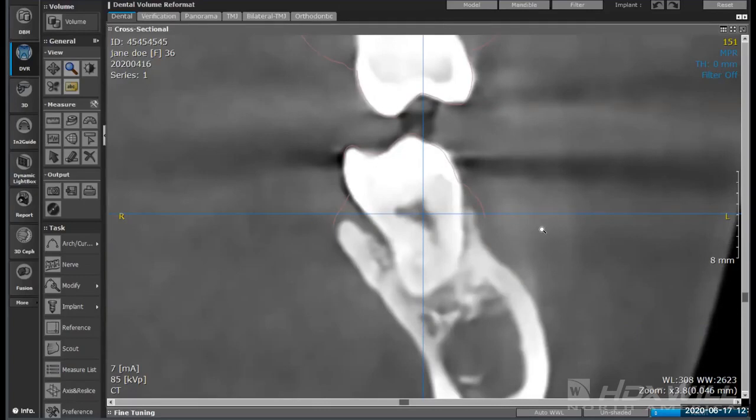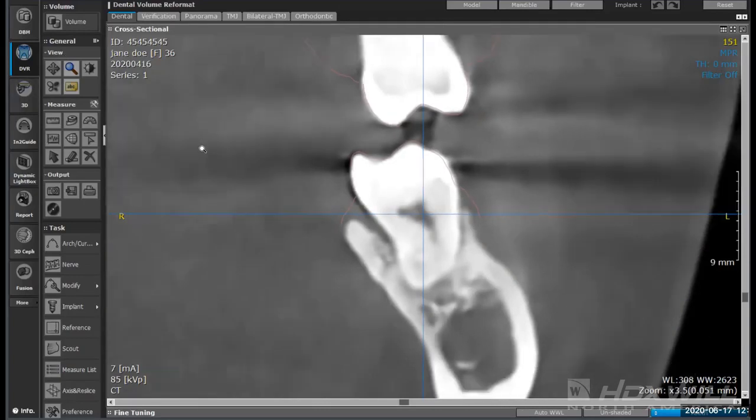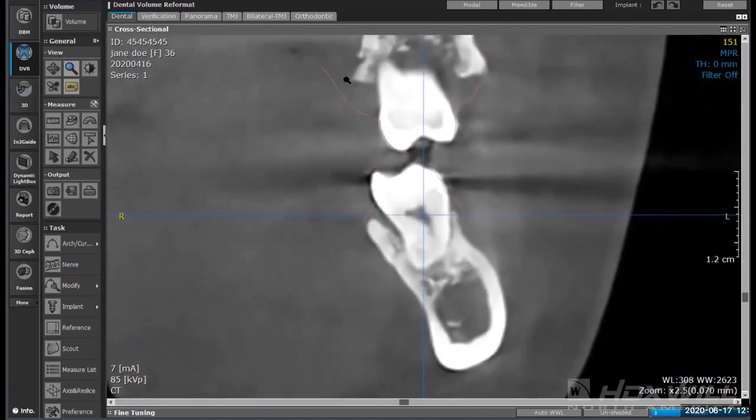right height. If we're doing something like a bone graft, I can bring this down, and now I can see the soft tissue on either side to be able to say that on the buccal side we have some soft tissue here. Depending on how high that scan went, you're able to make those assessments because now you know where the soft tissue is as well.